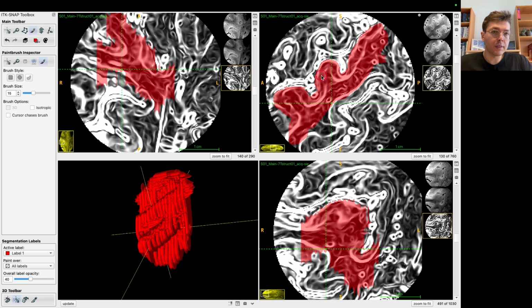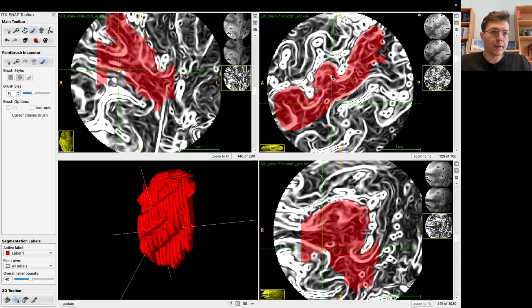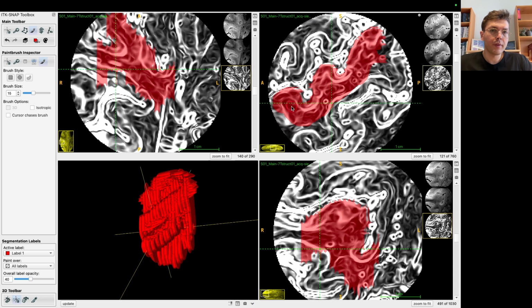And we know that everything is very well quality controlled and there are no sort of automatic segmentation related weird biases. Also, note that no one is using this data set, so there is nothing that works on it so nicely. And I don't want to turn this project into a segmentation methods development project. This just works, and let's roll with it.